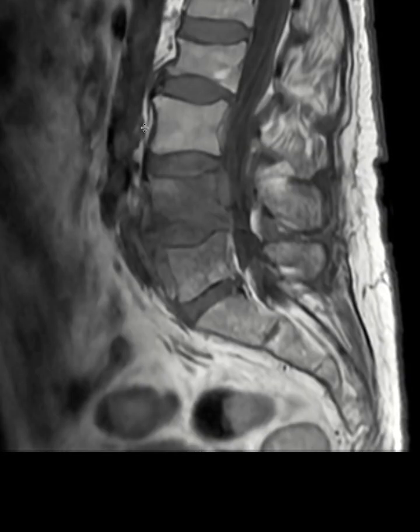If you look closely, all the fat in the prevertebral soft tissues is bright, but this fat over here, let me show it to you closely, these areas are all dark. So there is some process happening in the prevertebral soft tissues, and we are losing the signal related to fat. And if we look at the spinal canal posteriorly, we see there is also something in the posterior aspect of the disc, in the epidural space right there. So there is some epidural disease involvement here, which we're going to discuss on other sequences as well.